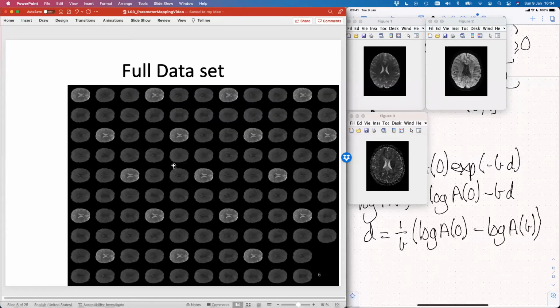So it consists of fibers pointing in the left-right direction, which is how the connection is made. And so we'd expect there to be a strongly anisotropic diffusion dispersion pattern within that region, elongated in the direction of the fibers, i.e. the left-right direction. Left-right on this picture is actually sort of up-down. So this is the left side of the brain, this is the right side of the brain.